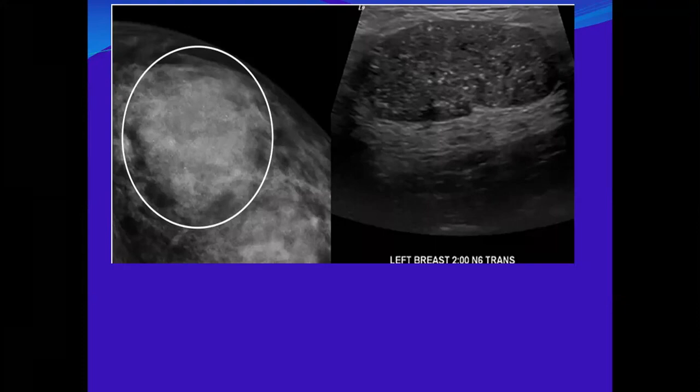It's okay. So what is next? The ultrasound. Why are you going to do ultrasound? To try to confirm this mass architecture, and even if you know it is a mass, you need to characterize it further, either upgrade or downgrade it, and localize it for biopsy.